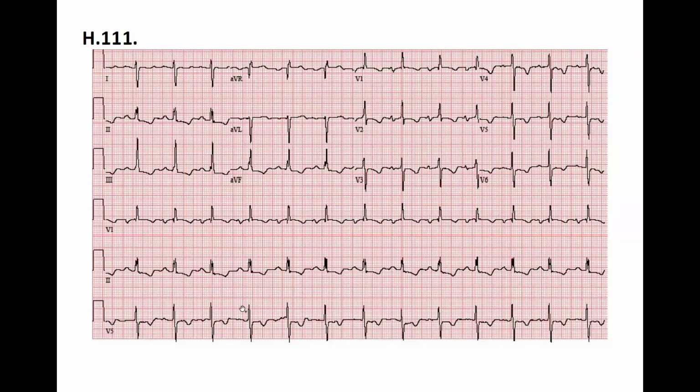It's a rhythmic heart ECG, and then there is a P wave. Actually, we do see P waves very nicely. And that's relatively positive in lead two, negative in aVR. So that can be a sinus rhythm. Okay, I accept it.